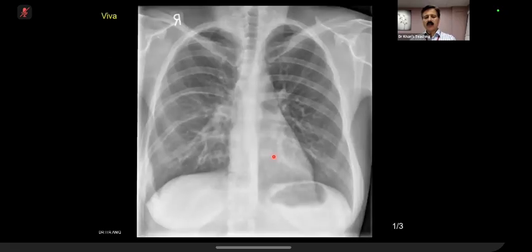Okay, last few films are left, and all of these, except for one odd, are classical 2B films and for observation. So this is over to you.